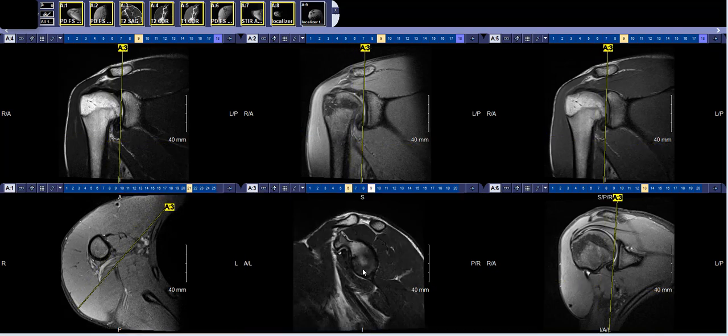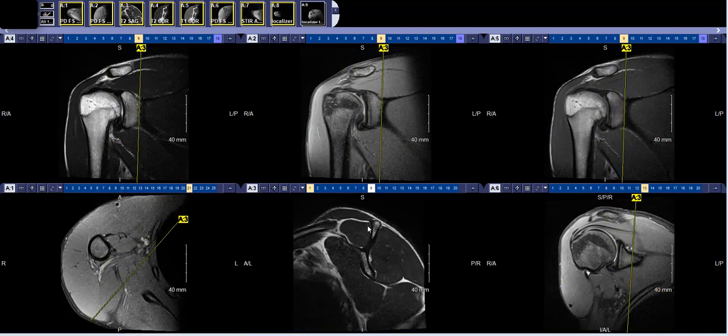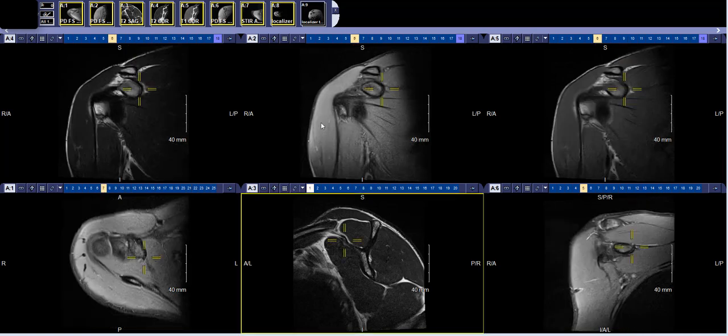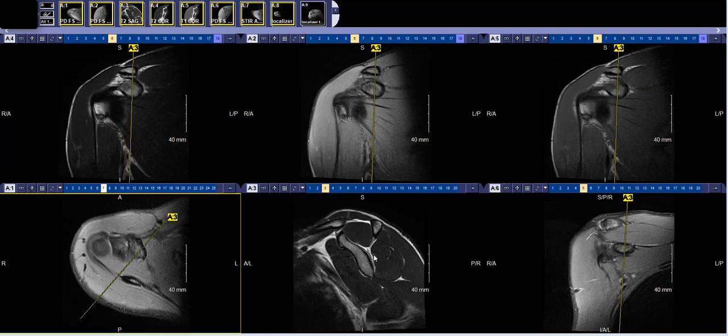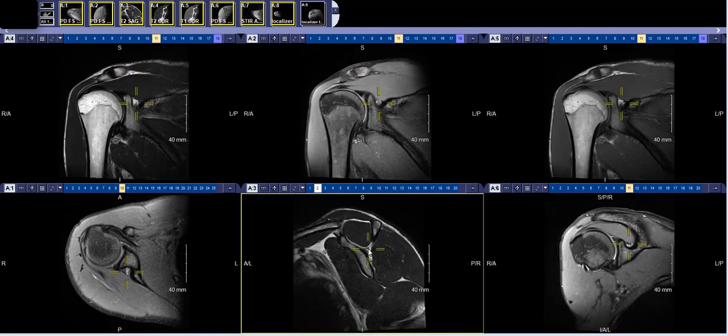And then in that regard, if I see pathology in supraspinatus or infraspinatus in isolation without a tendon tear, I tend to look at our suprascapular notch, which is going to be at the base of the coracoid as it joins the scapula in this region, as the suprascapular nerve innervates the supraspinatus and infraspinatus, and then also the spinoglenoid notch as the suprascapular nerve continues on to innervate the infraspinatus. So that's the essentials of my search pattern.